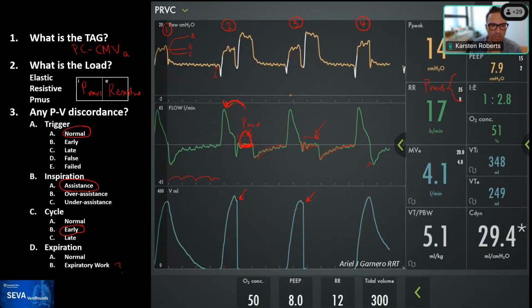I think that in order to determine if that were true, we would need to know if this is cardiac oscillations, as Eduardo mentioned earlier, or was this fluid in the circuit that's causing this noise? I think that certainly could also cause a false trigger, as you mentioned, Rob.